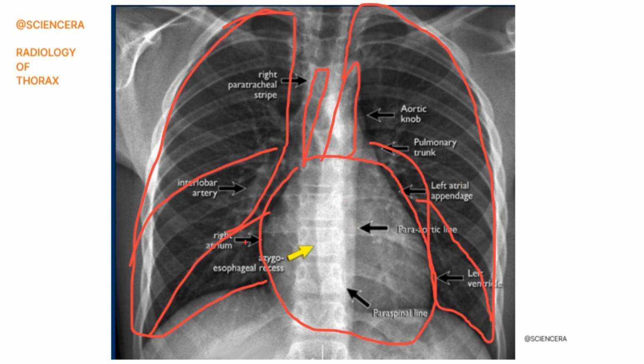And the structure between the two lungs is your mediastinum, where, as we said in the previous lecture, in the middle mediastinum, your heart is located. So these are the lines and structures doctors look at when reading an X-ray.